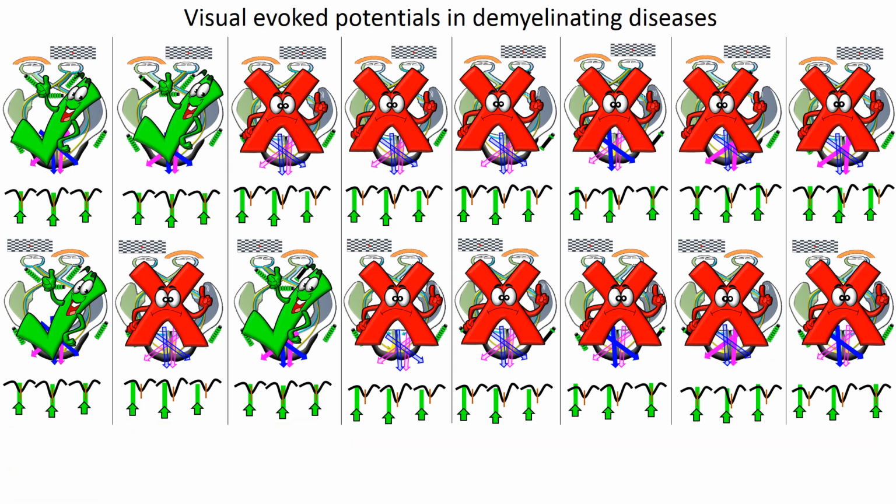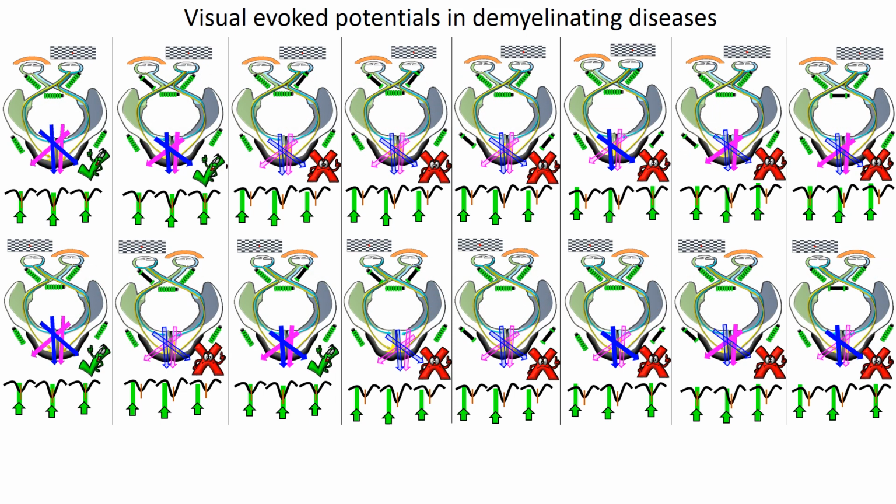As you can see in this frame, now I have miniaturized the normal and abnormal symbols so we can better appreciate the changes in the sagittal and parasagittal P100s. I will now start the analysis. In the first column, sagittal and parasagittal P100s are normal. So obviously the study is normal, a conclusion that can be arrived at without looking at parasagittal P100, as we have previously mentioned.